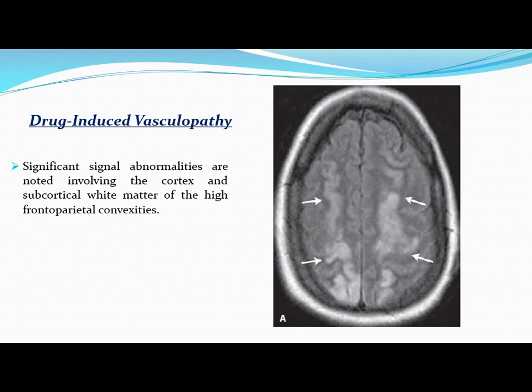Drug-induced vasculopathy: significant signal abnormalities are noted involving the cortex and the subcortical white matter of the high frontoparietal convexities.